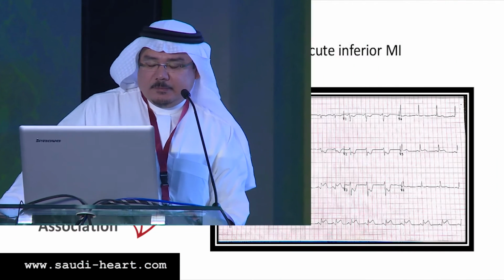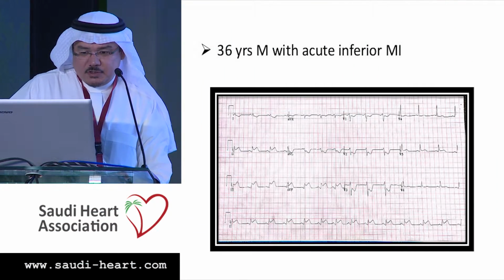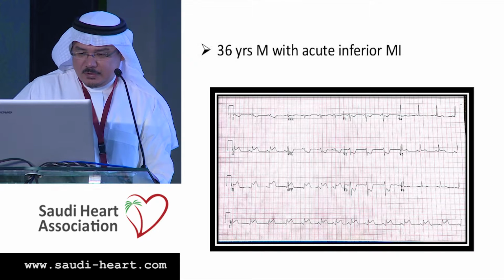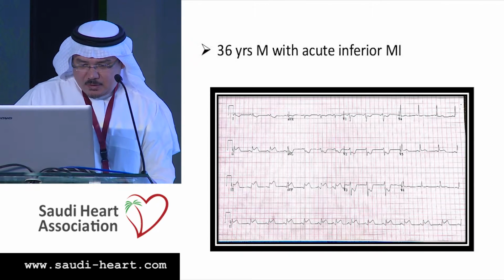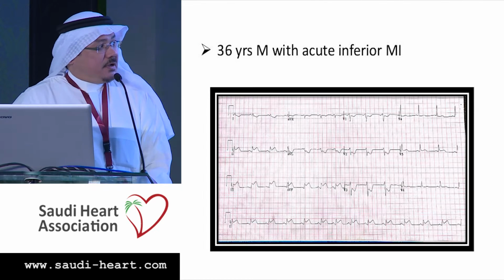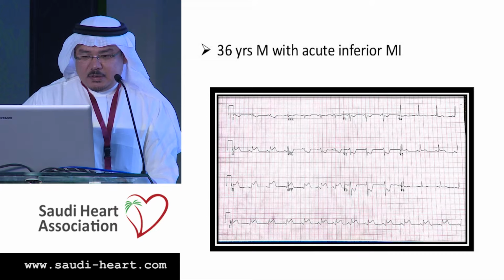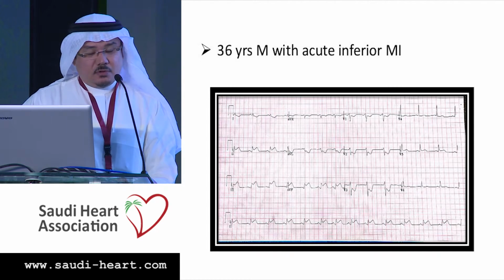This is a clinical case presentation. I think it will create a good discussion. This patient came to us last Eid al-Fitr holiday in the early morning with chest pain. This is his ECG in the ER. It showed that he has inferior MI, 36 years old.